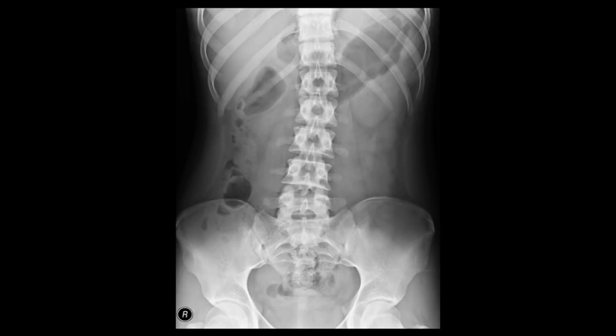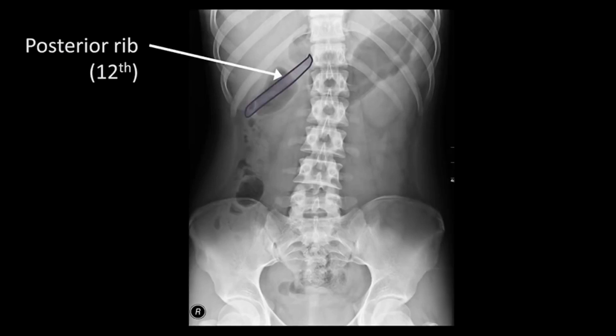Now we are moving on to see the different anatomical structures that are visible in this particular view. We should be able to see bony structures, the vertebrae, the iliac crest, lower ribs, the sacral foraminae, sacroiliac joints, symphysis pubis and all. Also, we should be able to appreciate some of the soft tissues, even though they are not that clear. So we will be seeing one by one. First, we will focus on the musculoskeletal structures.